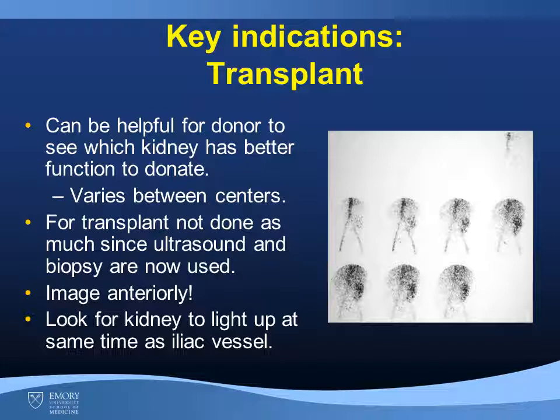For transplant itself, this study is not done as much anymore since ultrasound and biopsy are now considered the real gold standard here. First, if you do the study, remember to image anteriorly because that's where the transplanted kidneys are placed. You basically want to look for the kidney to light up at the same time as the iliac vessel.